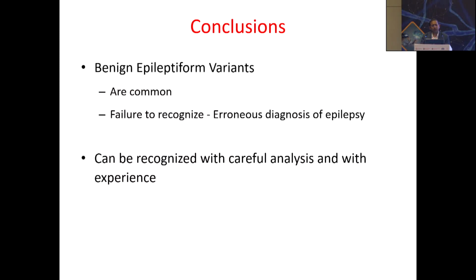So to conclude, benign variants are very common. If you are not able to recognize them properly, you may report them as epileptiform discharges, and that can unnecessarily lead to wrong treatment. So be careful while reporting these abnormalities.